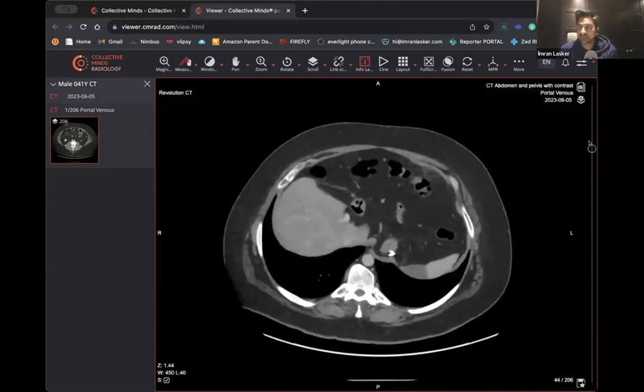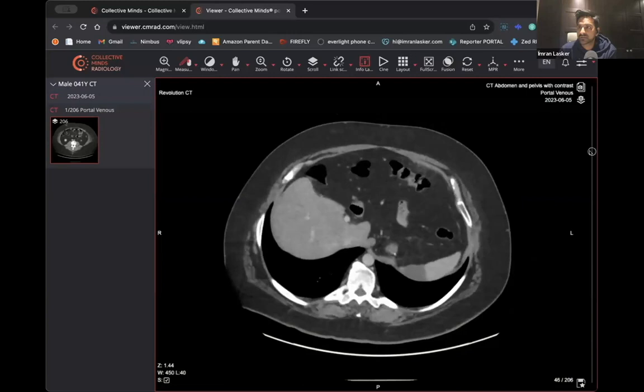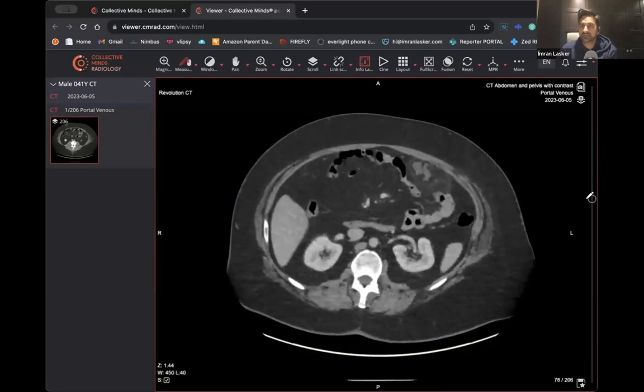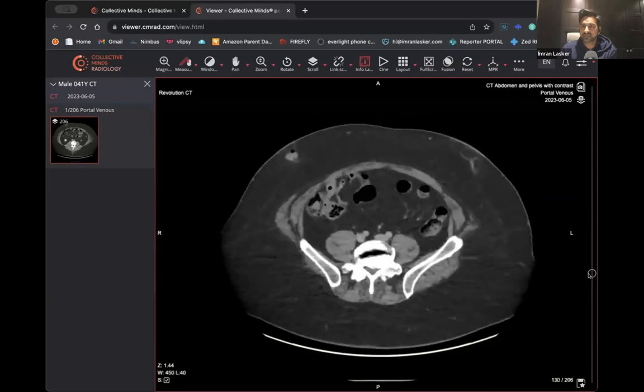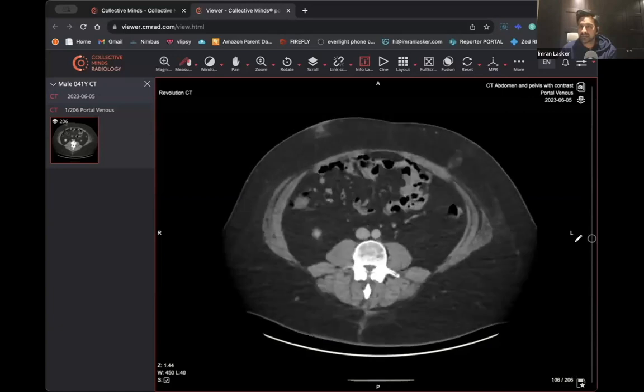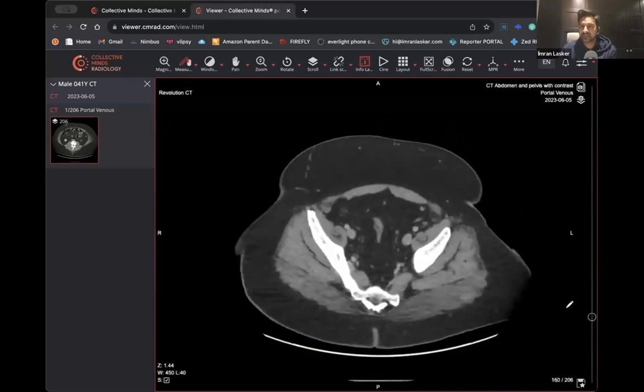And then what I'll do, what I promised, I'll do one scroll through. So let's go from the top all the way down, all the way down, like so. And look, that is okay. So now you've gone all the way down and all the way through.